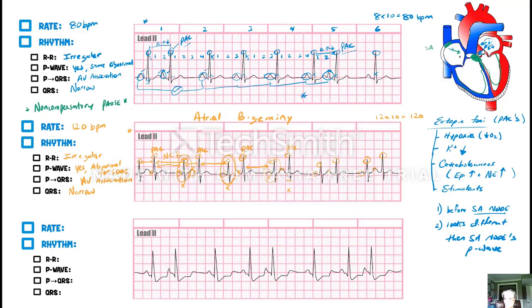Okay? So if you look here, here's a PAC, normal, PAC, normal, PAC, normal, PAC, normal, and then again another PAC, and then another normal one and a PAC. So that's pretty intelligent, right? That's atrial bigeminy. All right, let's move on to the next one.